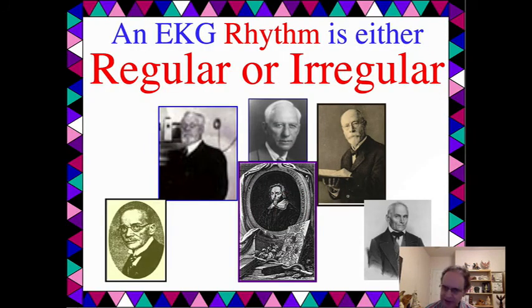Our rhythm is either regular or irregular. You got 2 choices. Someone says, what is that rhythm? It's regular or irregular.